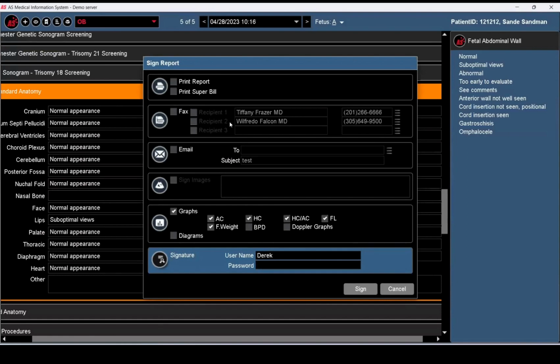This pretty PDF report will also be faxed out to the referring physician. Along with that, that PDF report will be sent back into the patient's chart within the EMR for viewing and visualization, along with an ORU HL7 message, sending those charges back, satisfying those charges within the EMR, truly creating a closed loop workflow. As you can see, AS Software's reporting is easier than ever, but still provides powerful, robust reporting tools for the physicians and sonographers that use it.